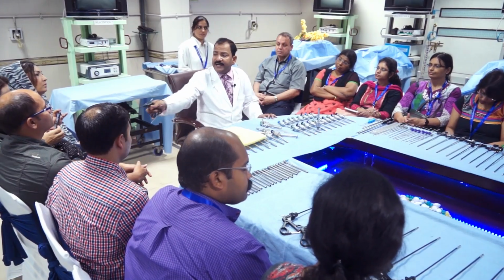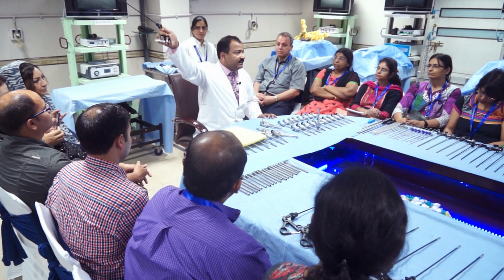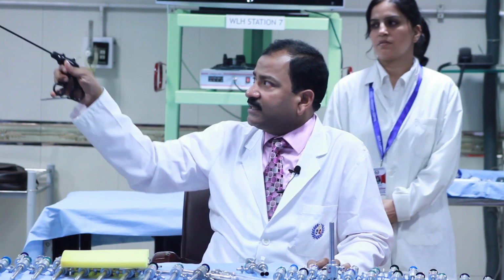If I stand here, then I will not see her, I will not see the wall, I will not see the ceiling, I will see only the screen. And if only the screen comes on my macula, that means resolution will be maximum.